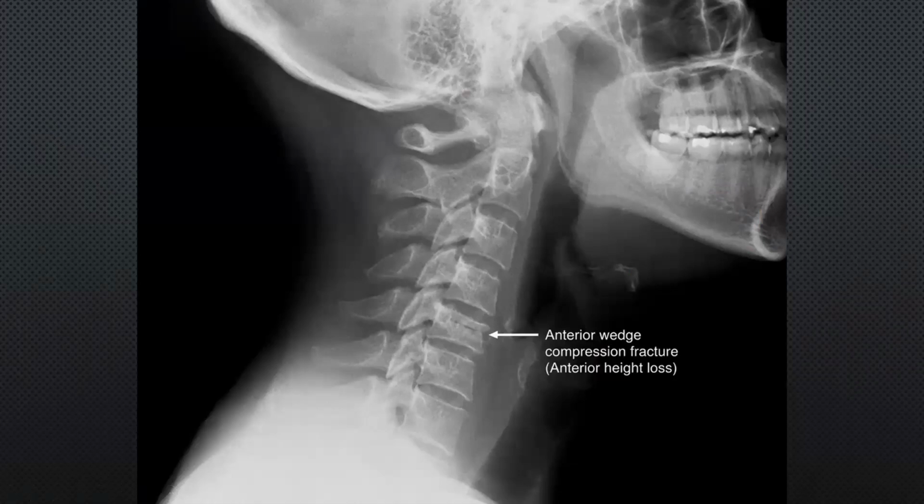Adequate, because you can see the four borders. You can see up, you can see down, you can see the soft tissues. So this is called adequate, right? Any information about the patient? No, it means not accurate. And the alignment, any problem in alignment? No, sir. This line is normal, this line normal, this line normal.